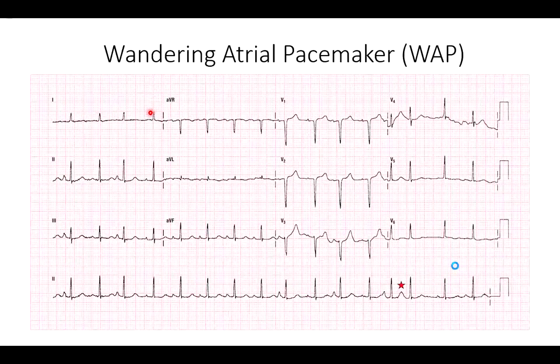Now look here. Do you see this example? I don't see any P waves here. And if I saw only this strip, I might be led to believe that the atria is not participating in this activity. But if I quickly look down the row, I see, oh no, there is a P wave. I just don't see it here. That's okay. I just don't see it in that one. So a couple things that we want to keep in mind as we're looking at a rhythm strip.